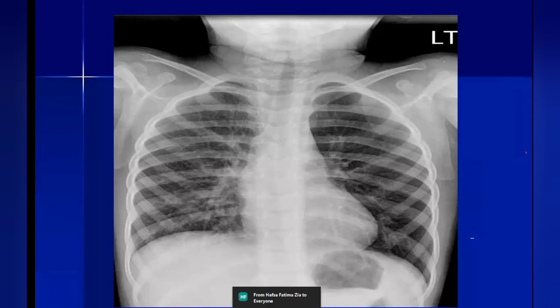You may even call the patient back and take the decubitus view to check. If you see more retaining of air, that means there is a one-way valve, which is the case here. So the child here was taken to bronchoscopy and found to have a partially obliterating foreign body in the left main bronchus. Yes. Thank you, Dr. Shahbaz.